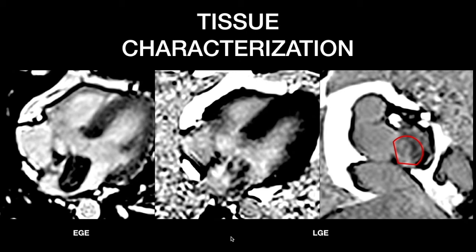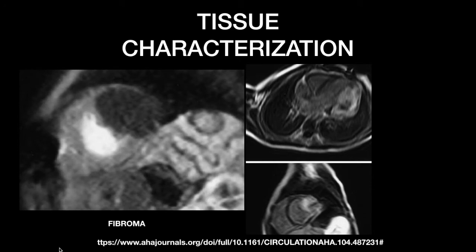So what is important is to characterize a lesion properly, as some cardiac lesions have typical pattern of intensity which helps to reach a diagnosis. Like the above example, which shows myocardial lesion appearing hypointense on T1 weighted images, no enhancement at all on the perfusion scan, but showing intense enhancement on the delayed contrast enhanced scans. Such ventricular lesion most likely represents fibrous tissue predominance, hence a fibroma.